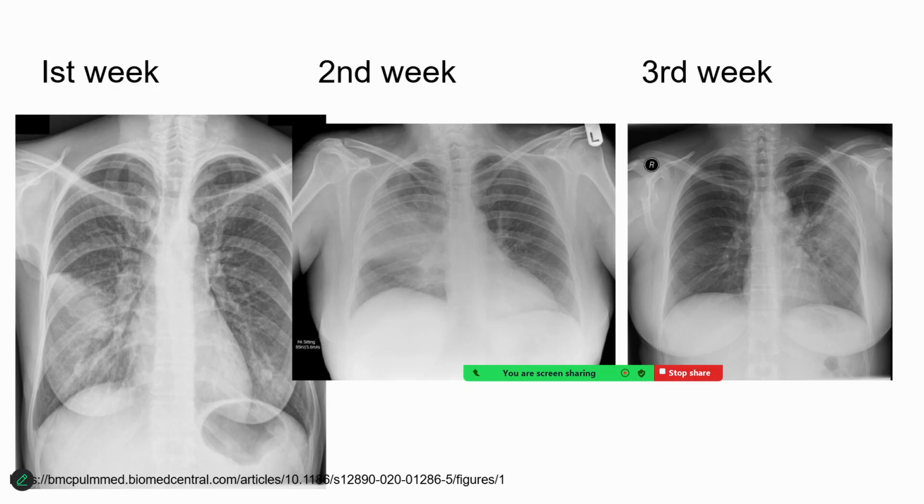In a standard typical infective pneumonia, the changes occur in a sequential pattern. Initially, in the first week, the consolidation is partial, and at that stage, if you take an X-ray, you will have almost a similar feature to that of bronchitis, like mottling being seen. The solidification or hardening would not be advanced. Of course, most of the time in pneumonia the area is limited to a lobe, and hence usually you call it lobar pneumonia, or it could be a segment, where it is segmental pneumonia, and so on.